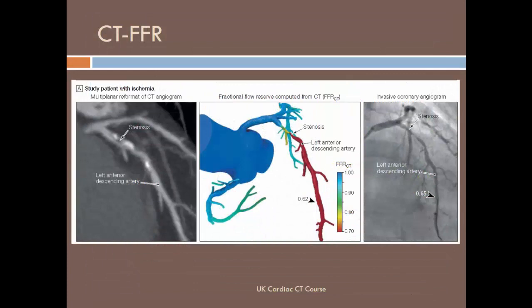So they showed in their initial studies a few years ago that this technique is clinically possible. Like in this example, the patient has possibly moderate stenosis from a mixed plaque in the proximal LAD, and this is the CFD modeling from that data. You can see the patient has an FFR of 0.62 in the distal vessel. So they can color code the degree of pressure ratio variation through the artery in this manner.